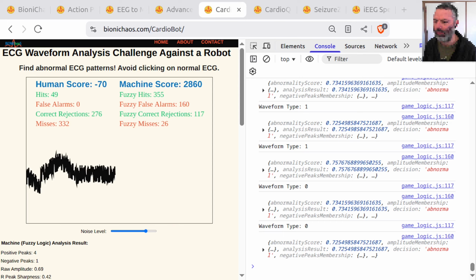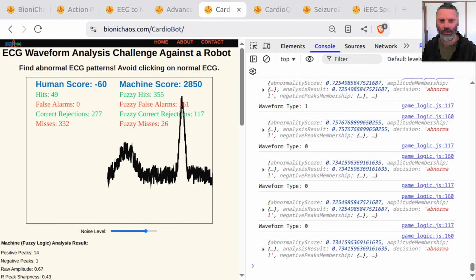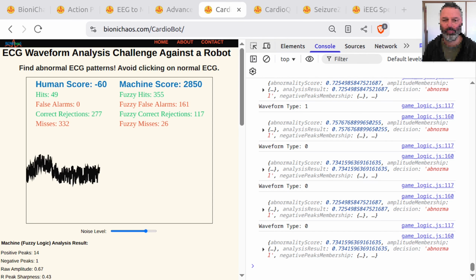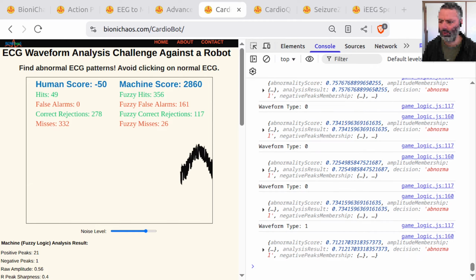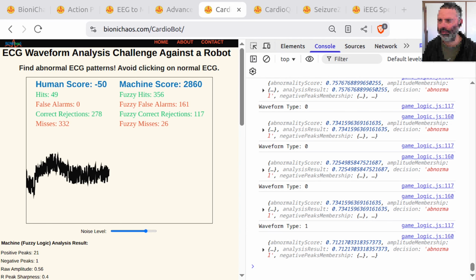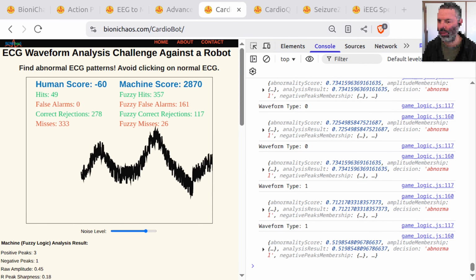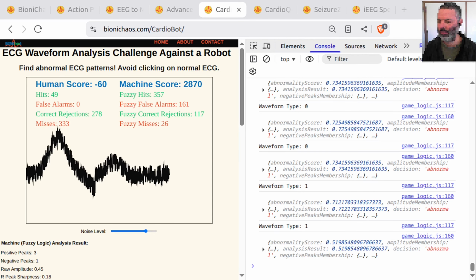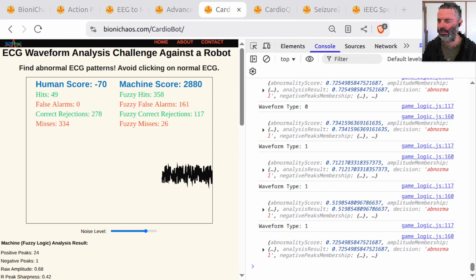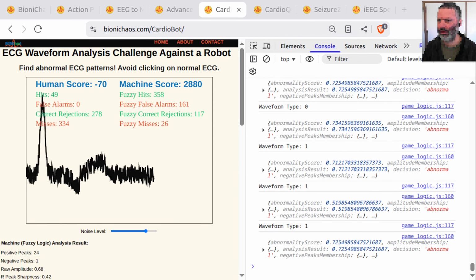Now let's talk technical requirements. The bottom text content, the technical documentation, is where we truly show off. We've mandated the explanation of the median absolute deviation, MAD, for peak detection. MAD. That's the part where the code says, I'm ignoring the tiny static and only looking for significant electrical events. It's a robust statistical filter. It shows the user that the underlying math is solid, not just a random line of code. And the R-peak sharpness being calculated as the width at half max. We made sure that detail was included.